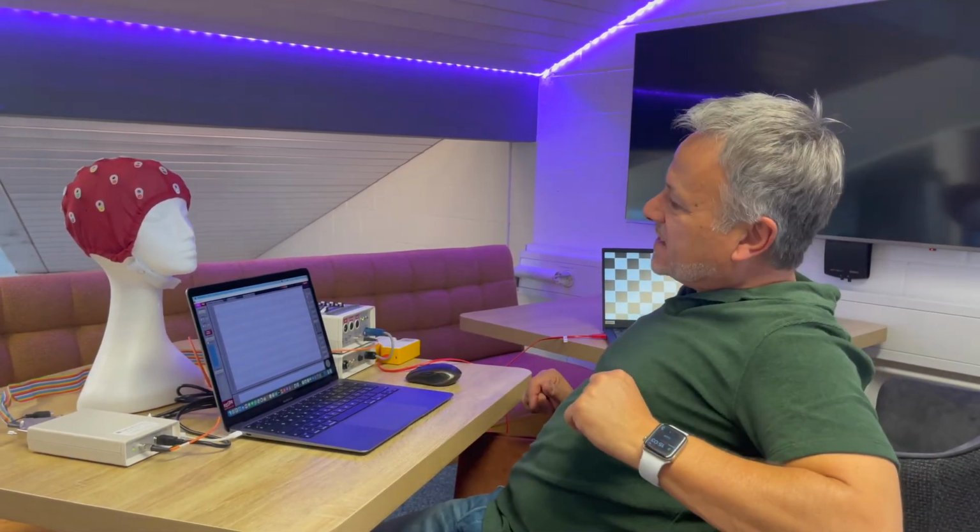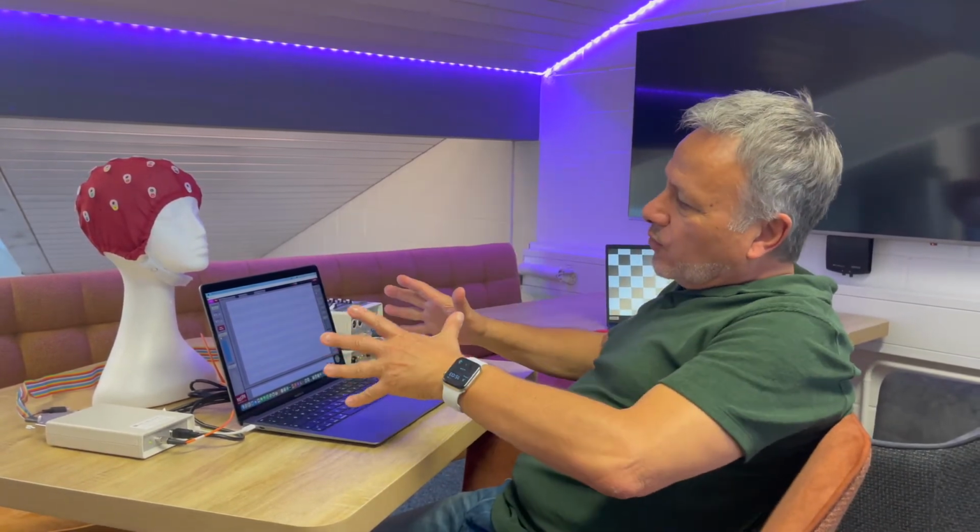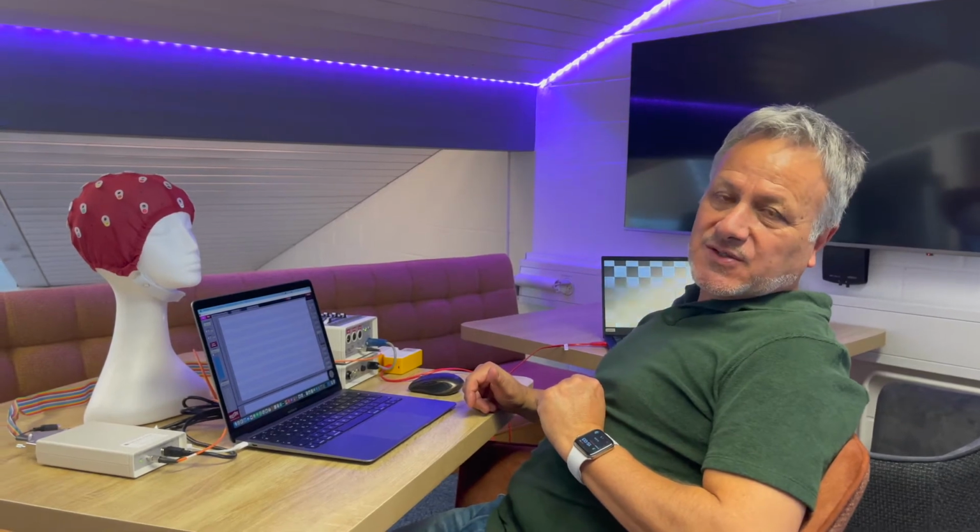As you can see, I've set up the ActiView, I've set up the USB receiver, all running on a MacBook Air or a MacBook Pro, it doesn't really matter. It runs on an M1 processor, it runs Big Sur. It's a huge challenge to a lot of people out there trying to run this thing on a Mac. We have solved it, we have a workaround, works beautifully. I will tell you step by step how this will work.